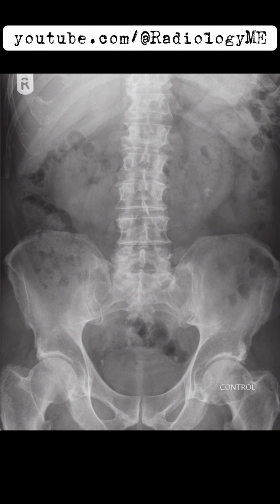This would be a case where we might anticipate questions from examiners about the differential diagnosis of calcifications within the renal tract. For example, they might ask about distinguishing features of phleboliths versus renal calculi. Phleboliths tend to be smaller, often with a lucent center, and are located outside the renal tract in the pelvis, while renal calculi are typically denser and more consistently opaque, particularly if they are composed of calcium.